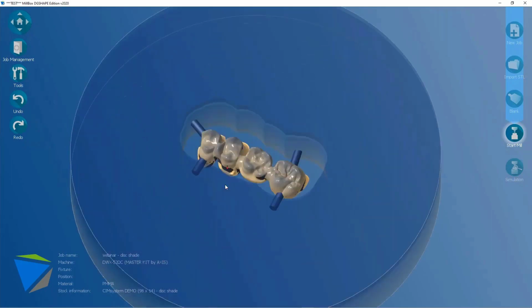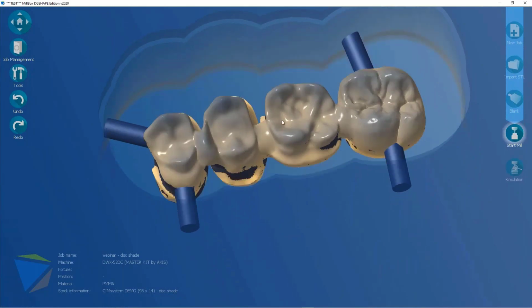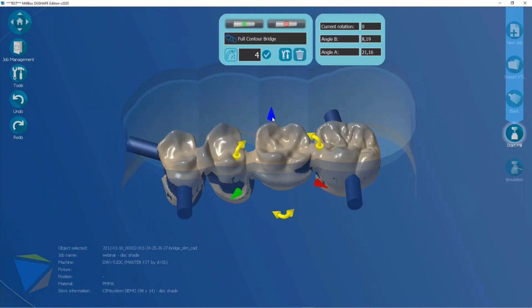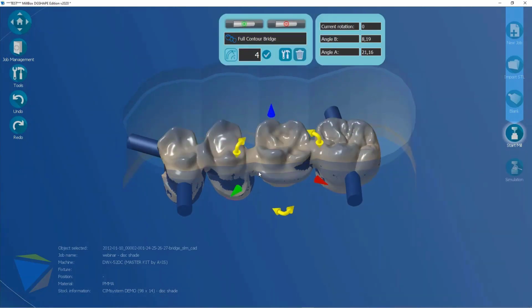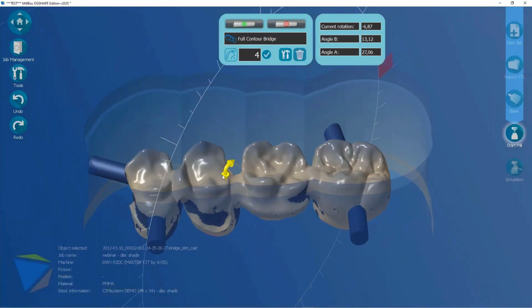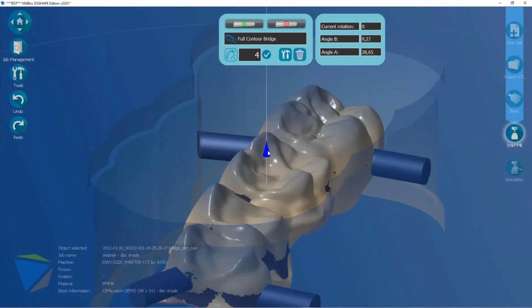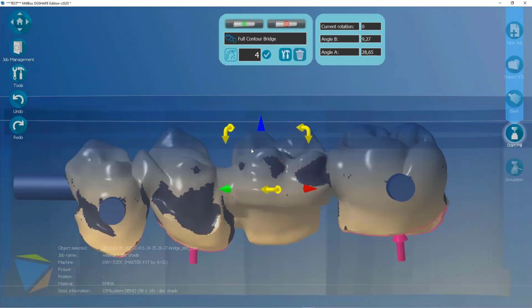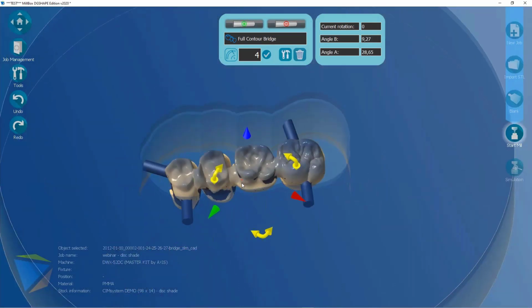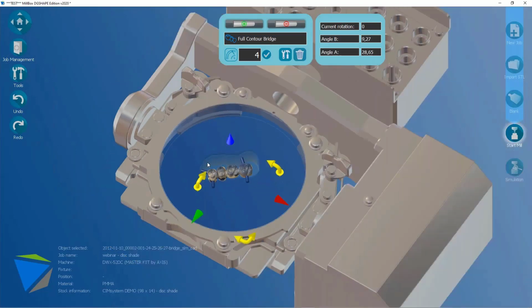And here it's very comfortable, because in this way the system, by modifying the mesh and the color of the mesh, lets you simply analyze, adjust and align the object according to the color of the disk, in order to properly assign the color in each position, wherever you want. So in this case, you can see that by moving the object up and down, you can assign different colors according to the disk properties.